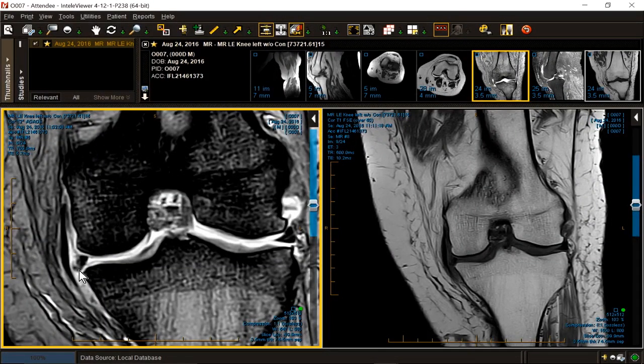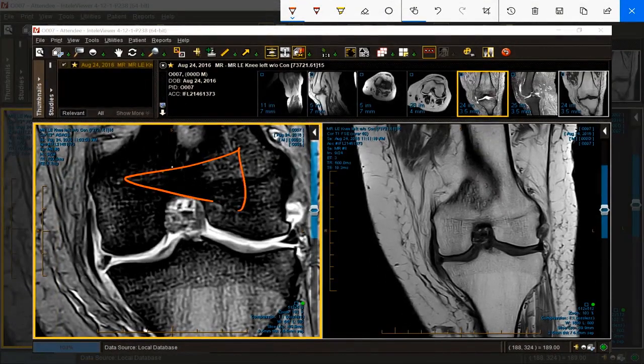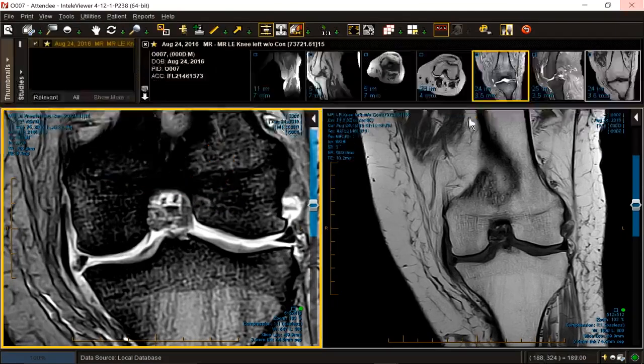You generally never want to go in and take out the outer third of the meniscus. If you took this out, you never want to go in and take that out, because now you get a total knee when you're 32 years old. So I am very liberal about signals in the outer third. I'm very conservative in my discussion about how I handle tears in this location. Let's keep going, shall we? Because there's more.